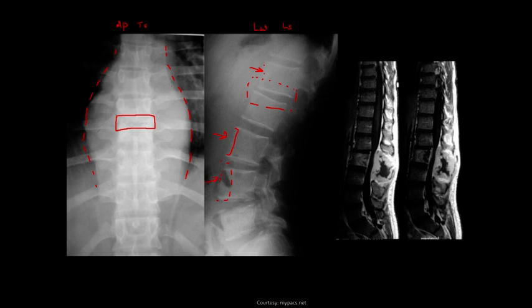Combining these areas with the thoracic spine, this is consistent with TB spondylodiscitis. We can see a nice large abscess in this individual in their posterior soft tissues. It's destroyed the spinal tissues, and we have some change in this L2 vertebra. So destruction there, as well as that posterior aspect.